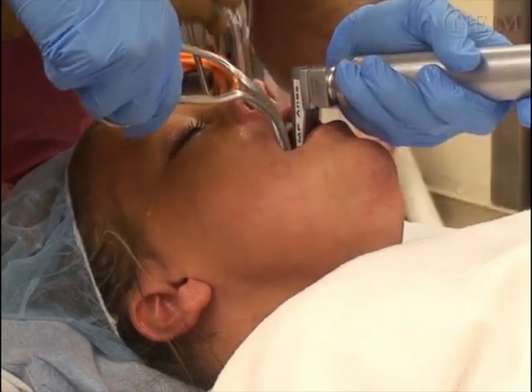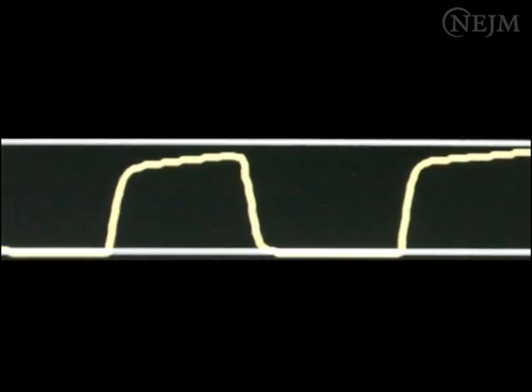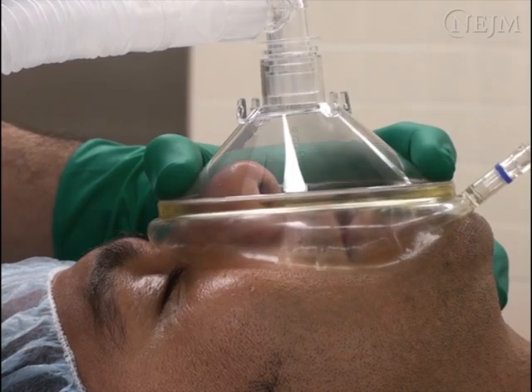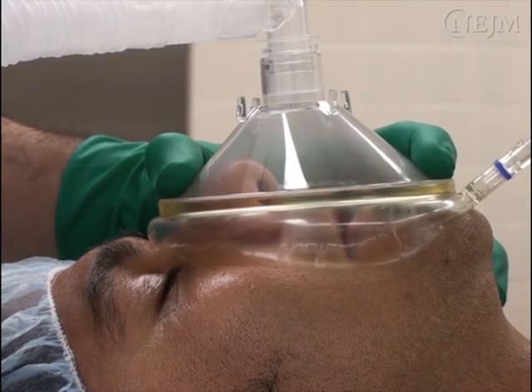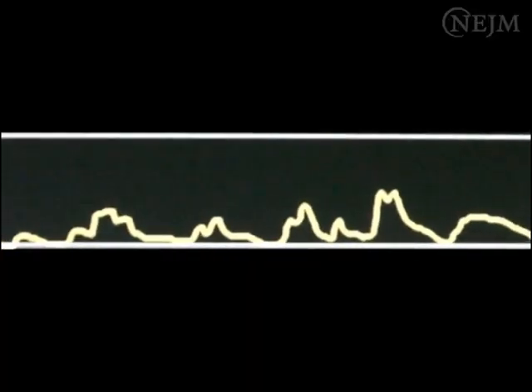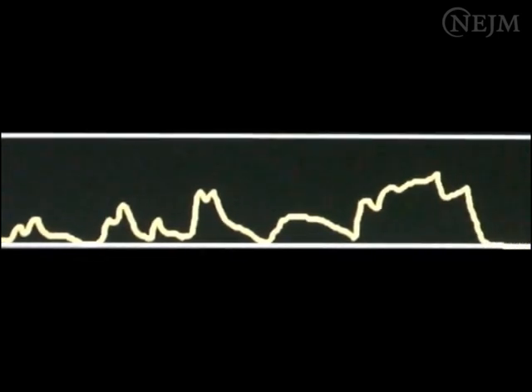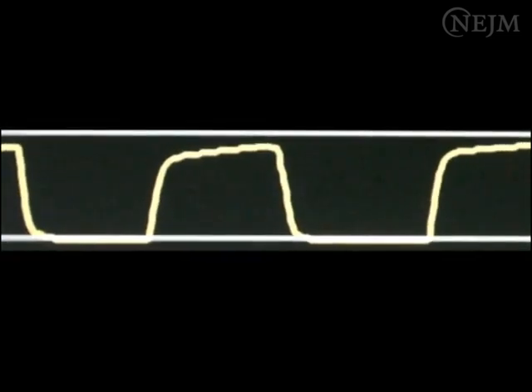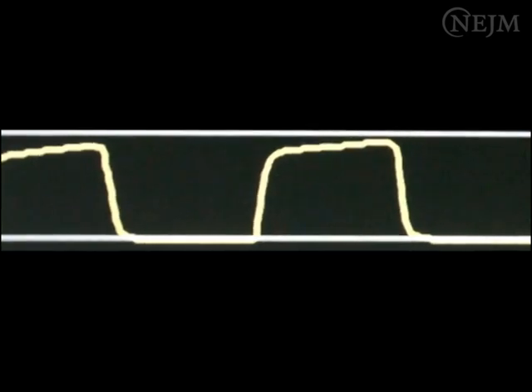In patients undergoing endotracheal intubation, capnography helps to show that the trachea, and not the esophagus, has been successfully intubated. However, if the stomach is insufflated with air that contains carbon dioxide, or if the patient has recently swallowed a carbonated beverage, the capnogram might transiently show the presence of carbon dioxide, even if the endotracheal tube has been erroneously placed in the esophagus. A series of successive, steady, normal capnographic waveforms must be seen to rule out esophageal intubation.